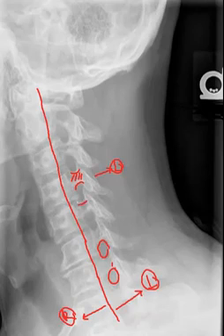Notice that the floor of any particular IVF is the pedicle also. So now we have two margins of the intervertebral foramen. Let's come up to the segment above. Let's draw our attention to the anterior margin of the intervertebral foramen. Notice that this anterior margin is comprised of posterior vertebral body, intervertebral disc, and uncovertebral joint anteriorly.